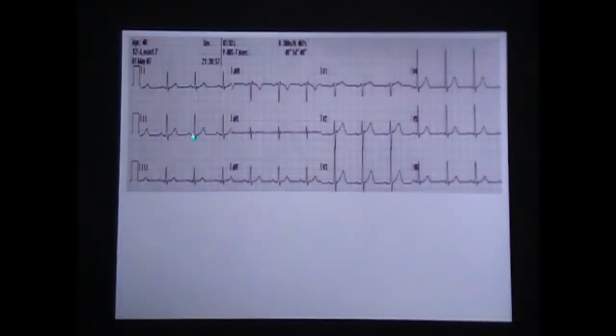I don't see any sort of Q wave here that would indicate previous history of infarct. Overall, the EKG looks pretty good. As far as this pattern here, we've got the higher amplitude. I think that would probably indicate maybe a COPD type history. Well, we do have those S waves, and then we have some increased amplitude, but no depression. So yeah, I would not see anything on here that I thought was acute.